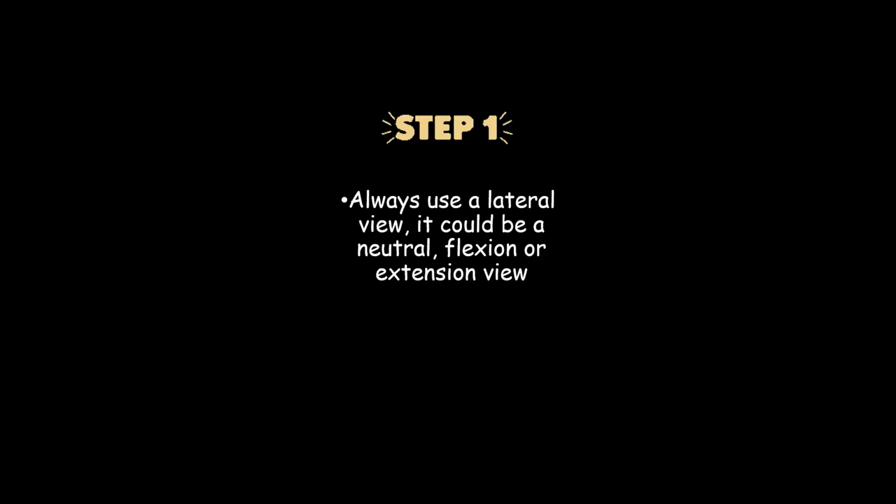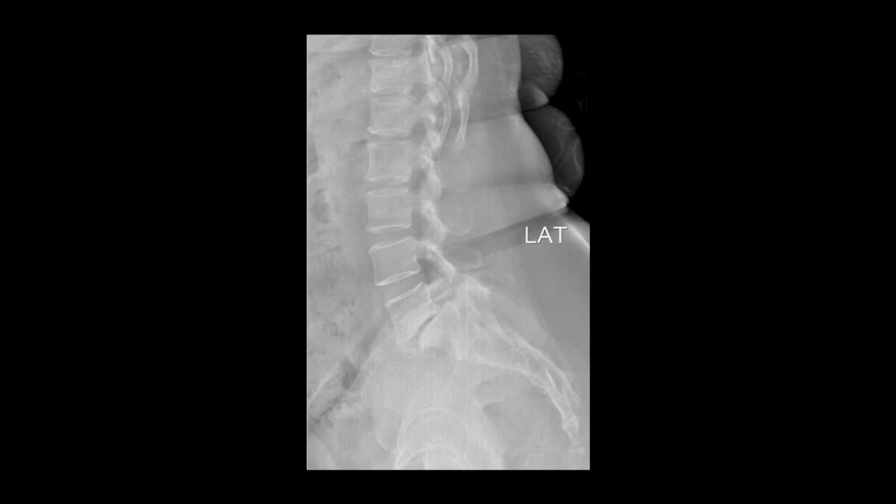Step 1. Always use a lateral view X-ray, whether the X-ray is taken with a neutral spine, in flexion or in extension. We know that it is the lateral view of the X-ray when we see the term LAT written on the side of the X-ray.